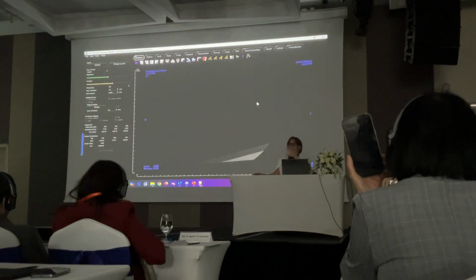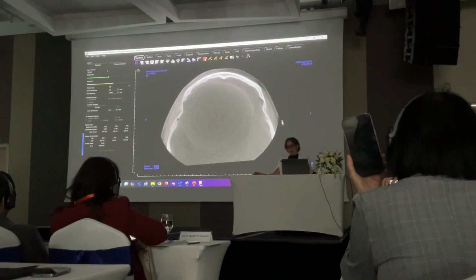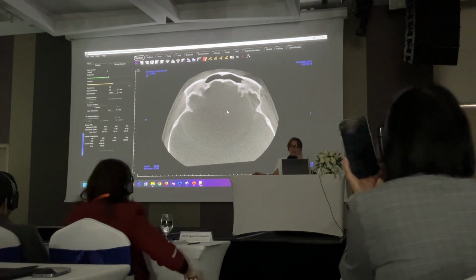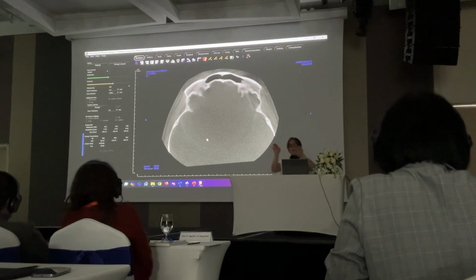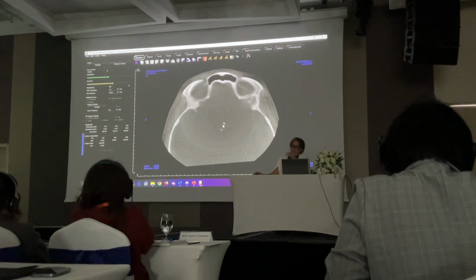And then now back to the top of the scan, we're going to take a quick look at the soft tissue outline of the outside, also the soft tissue uniformity here. You cannot diagnose anything in the soft tissue. It's impossible because on cone beam CT, you can't tell the difference between different soft tissue structures, but if you see a calcification in the soft tissue, you'll be able to pick that up.